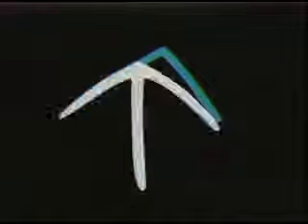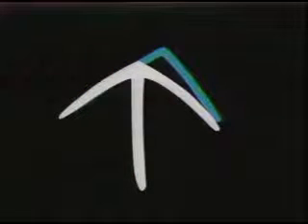And here we have another abnormal situation. It's to say the patient is not able to get his mandible to the left. So there is some hindrance in the right condylar area or in the right muscular area. In this case, we have the disturbance in the left condylar area, because the condyle goes farther back on the left side than on the right side, as you can compare it with the normal tracing.